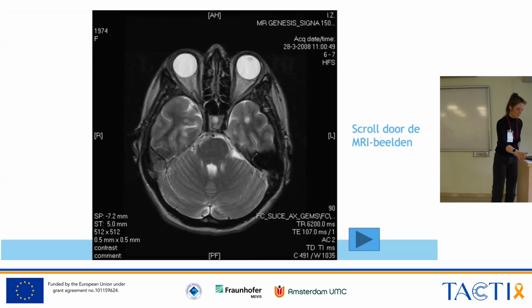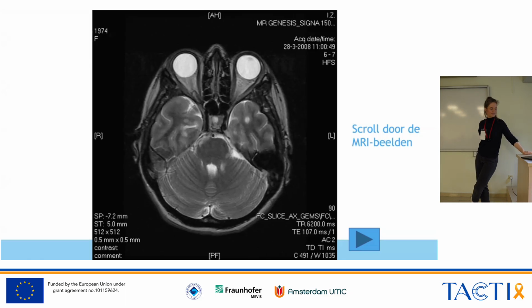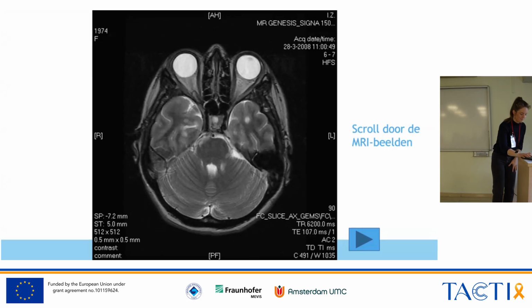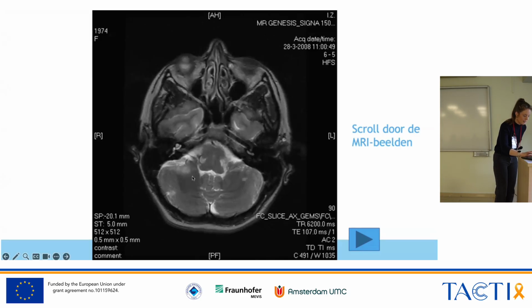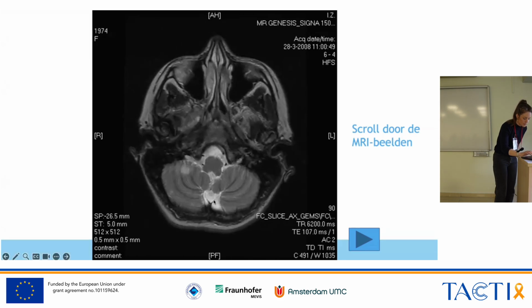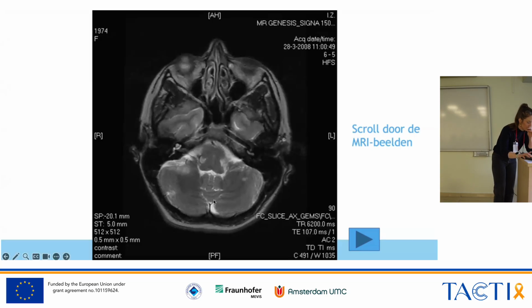Here. This is the central vein sign. You see this line going through? It's like now it looks like a coffee bean. Yes, and I think this is a prominent one, and here we have one, here we have one, here we have one. There's a juxtacortical, intracortical, infratentorial on the right side.